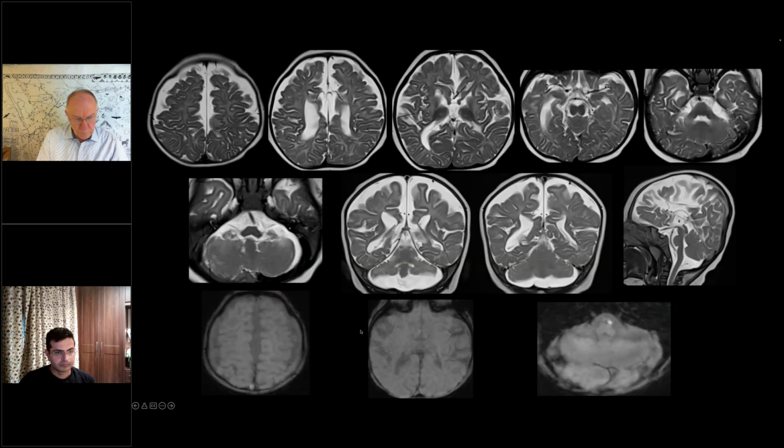Just wanted to show the MR images, which are mostly pathognomonic of the condition. You have supratentorial volume loss, dilated, scalloped, irregular, wavy, outlined lateral ventricles, atrophy and gliosis of the bilateral basal ganglia, and also reduction in the volume of the bilateral thalami. The inferior aspect of the midbrain demonstrates this characteristic figure of 8 appearance. There is reduction in the volume of the brainstem.